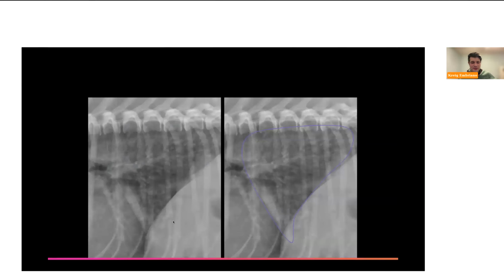This is the same radiograph on both sides, just circling and highlighting. Notice how grayed out everything is in between those vessels and bronchi. The vessels and bronchi are not nearly as isolating and distinguishable for your eyes. And in between them, it's just a hazy increased opacity, right? I can still make these vessels out. They're just not nearly as well defined.